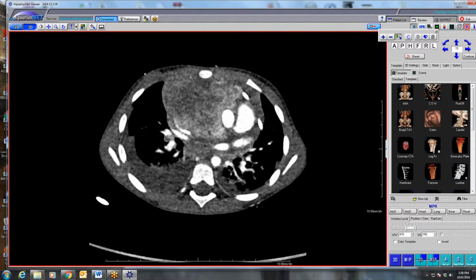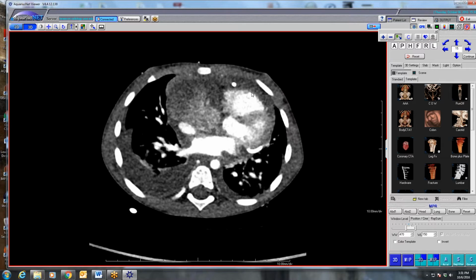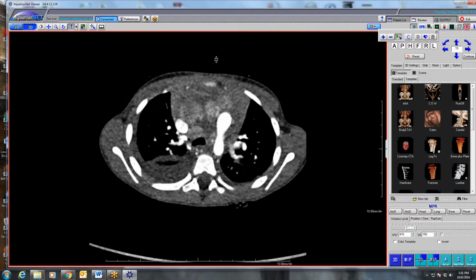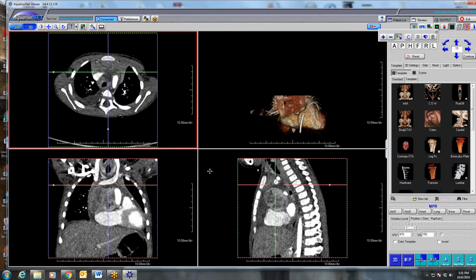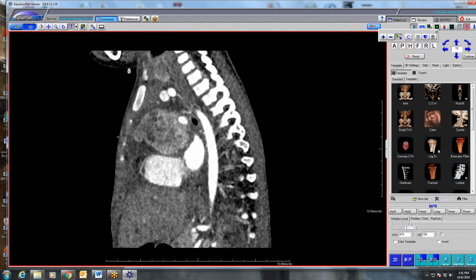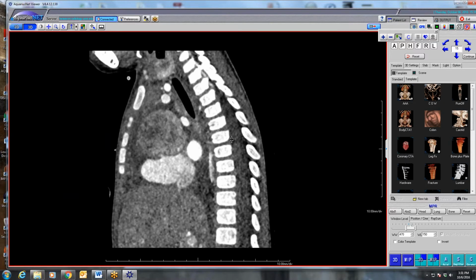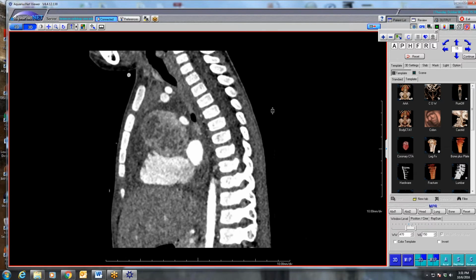No. It was definitely... pericardium was all around this, and that's why there's this big effusion. So this was pretty much complete, and that's a fair point. We debated about that, but it is deep to the pericardium. Got it. Yeah. It wasn't a mediastinal lesion.